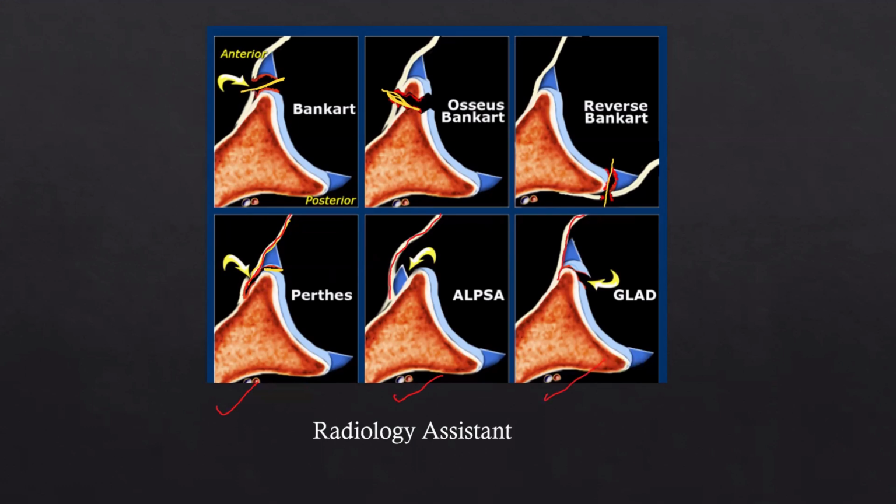Here in the Perthes lesion, the labrum is disrupted. In ALPSA, the labrum is disrupted and displaced medially. In GLAD, the glenoid articular surface itself is disrupted. So those are the most common types of anterior shoulder dislocation. Okay, let's move to our next case.